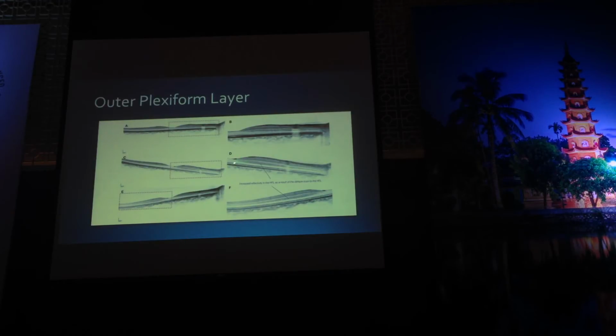So that's why it becomes thicker here compared to this figure, because of the way it is oriented. And here as well, at the temporal macula, when you tilt the eye, you can see the outer plexiform layer is kind of wider, even at the macula area, because it depends on how it's oriented according to the OCT light.